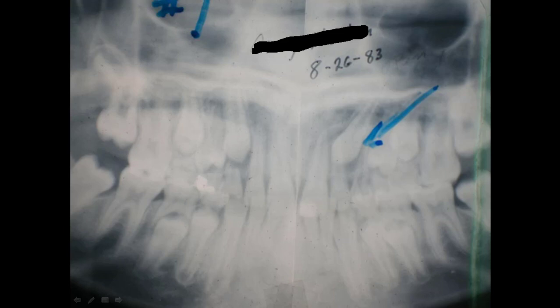Now here is the permanent bicuspid, I think is headed here and here, and these are the baby teeth, and here is the deciduous cuspid line in here, and it's relatively unresorbed in this area, so it may have had something to do with the tooth being positioned this way, in that the resorptive power of this tooth did not really resorb this deciduous cuspid root, and that may have been one of our causes here.